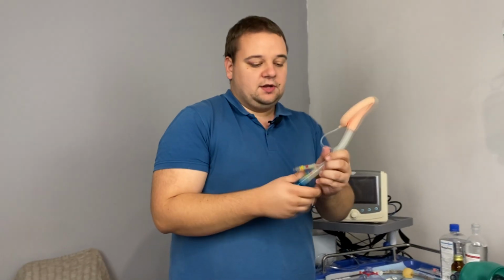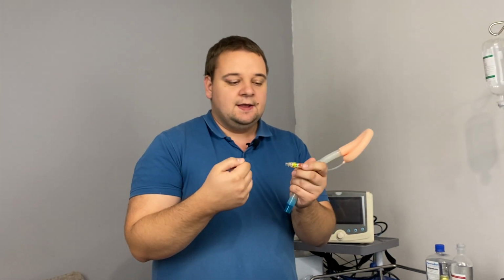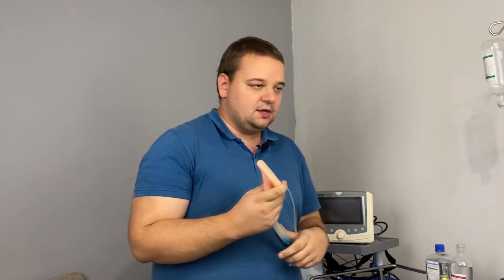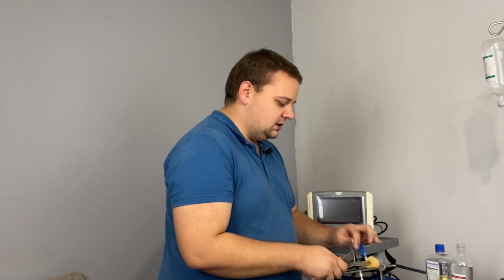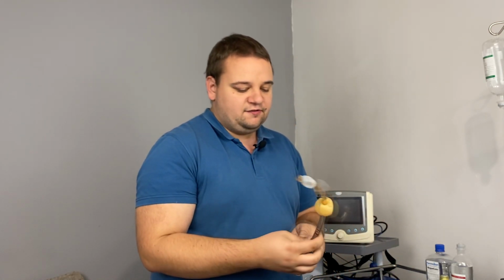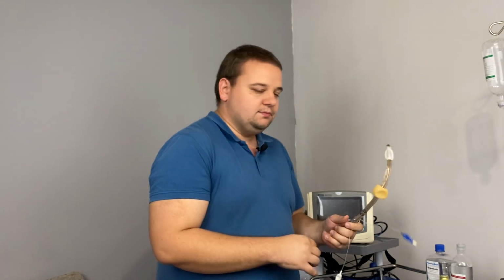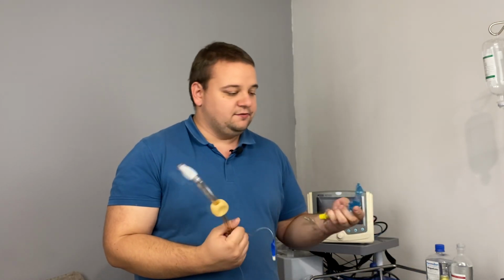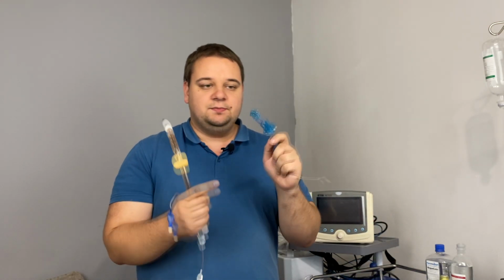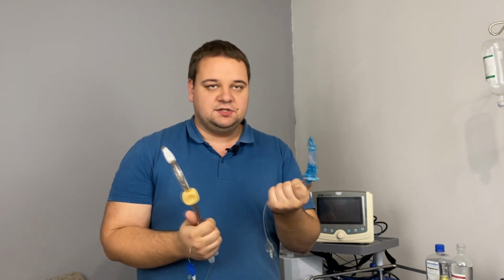So if we don't have it, we can have some additional tool that is attached here on this side, and it will measure the pressure manually. Unfortunately, we don't have it right now. Then this could be enough, but somehow some rescuers managed to intubate patients by accident with these 2 tubes, and this is of course bad. For example, if you intubate a patient with this tube, you will seal off the trachea with the distal cuff, and the patient will not get any ventilation at all.